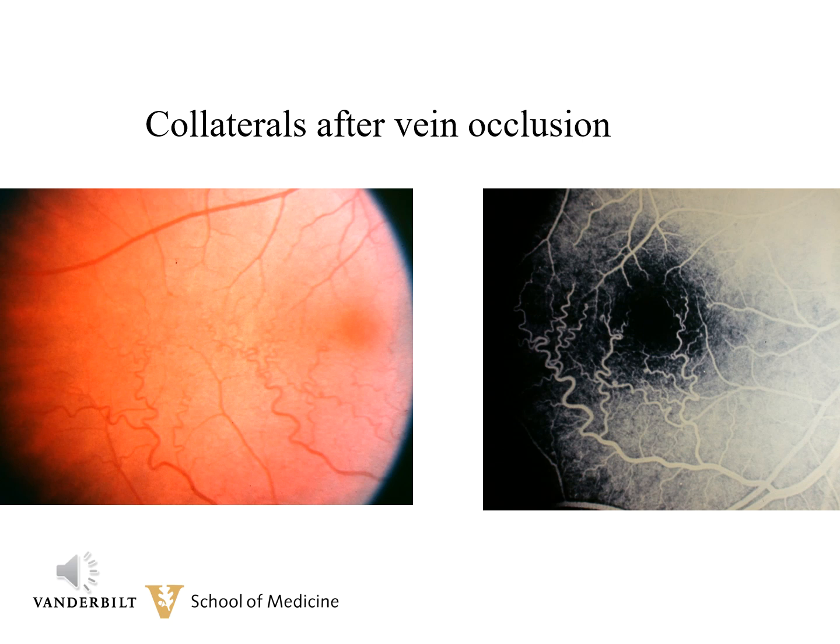The fluorescein angiogram shows these quite well. So the patient had a prior vein occlusion. Now, based on the collaterals, I don't think you can say exactly where the occlusion was, but you do know this patient did have a vascular event.